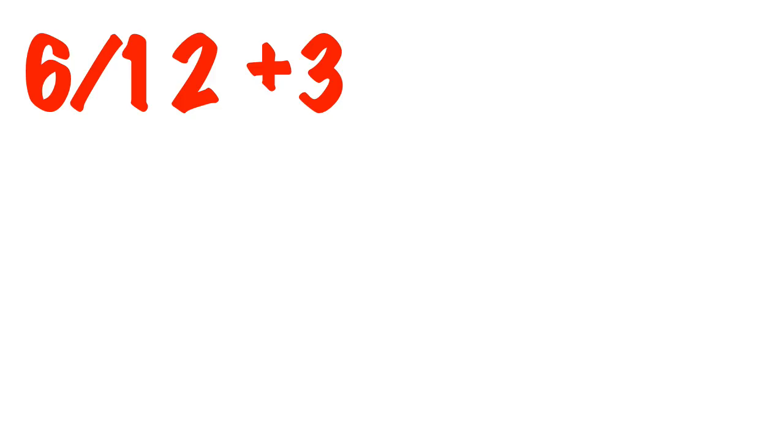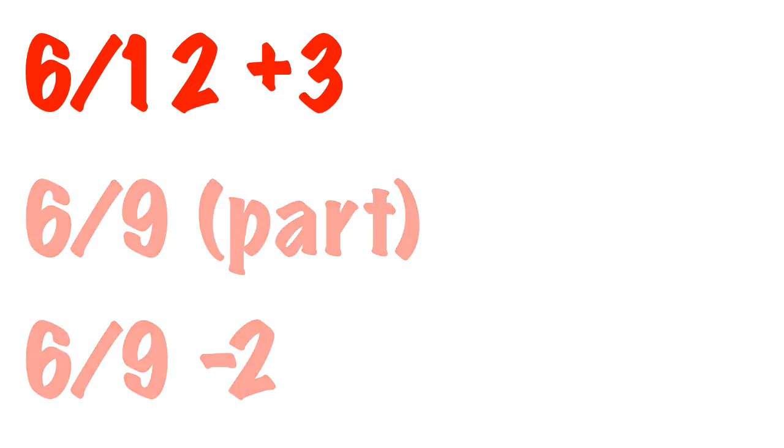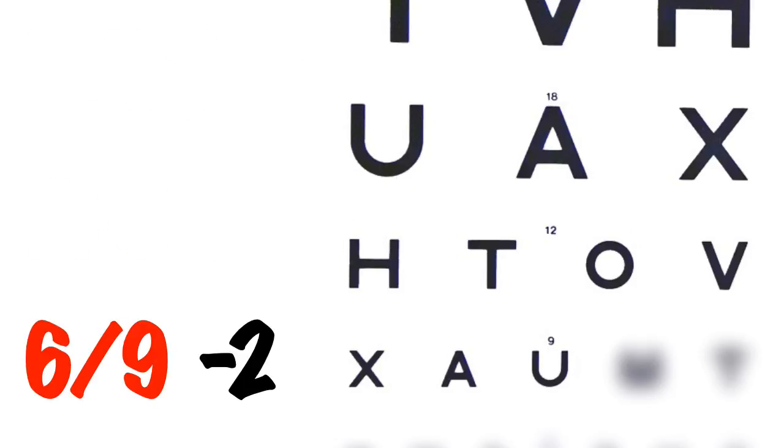Sometimes you may see VAs expressed as 6/12 plus 3, or 6/9 partial, or 6/9 minus 2. Confusingly, they all mean exactly the same thing: that the patient can read down to line 12 and get 3 letters from the next line down, part of line 9, or all of line 9 apart from 2.